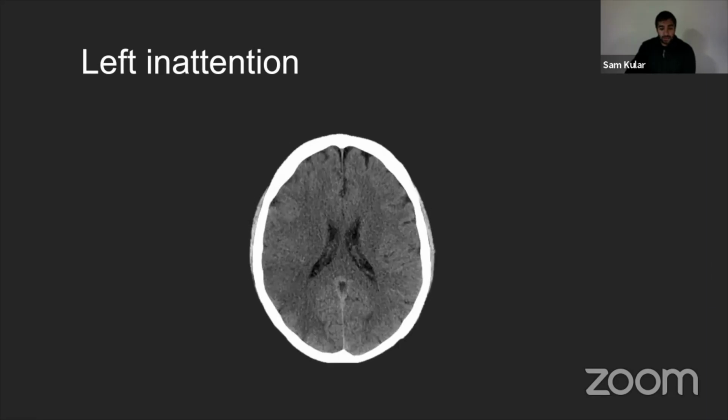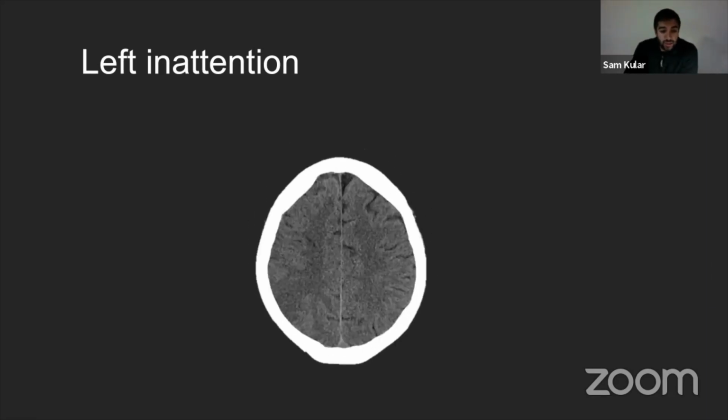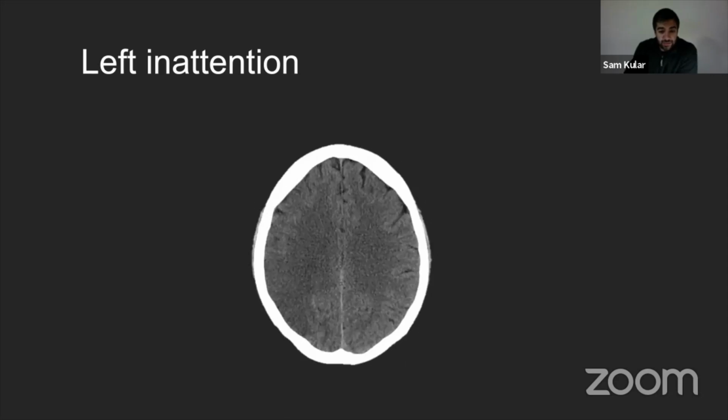And for the eagle-eyed amongst you, if I freeze on this frame and compare the left side of the patient to their right, you'll notice that there is a dark region here that is seen within the right side of the patient's posterior parietal lobe, bordering on their occipital lobe.